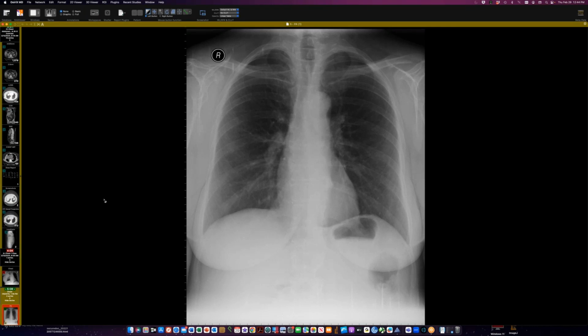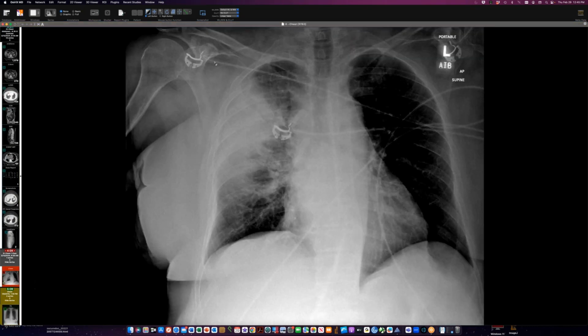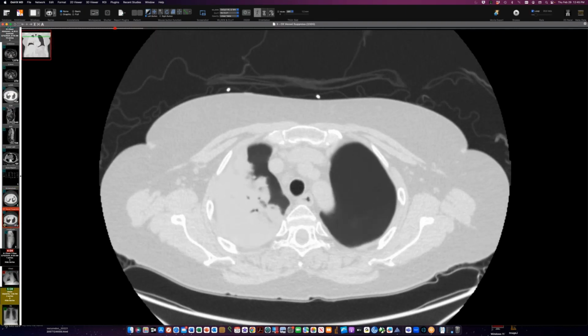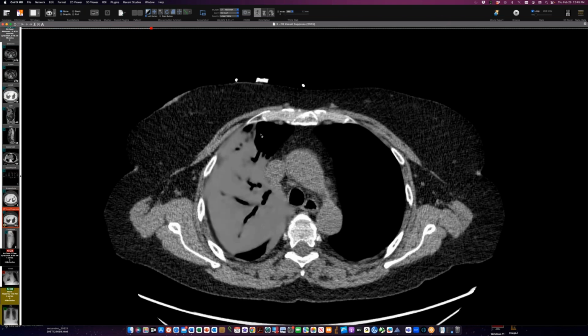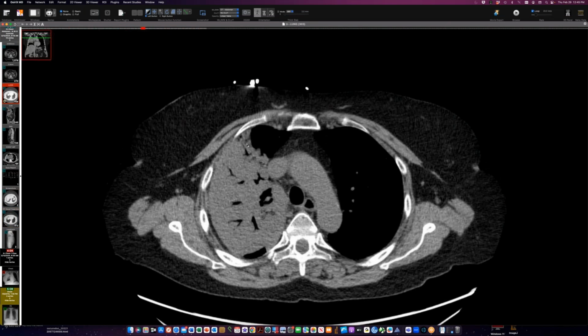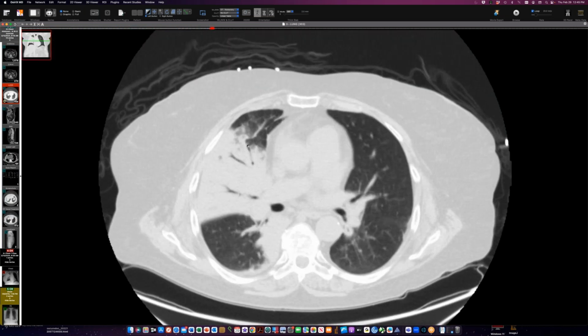Okay, this person had at this point a pretty normal looking chest radiograph, and then had fever and cough, and then had this radiograph here with this big upper lobe, mostly upper lobe pneumonia here. And on CT, indeed there is a big pneumonia with nice air bronchograms, a very dense pneumonia. Let me give you better imaging here. So a really bad pneumonia.